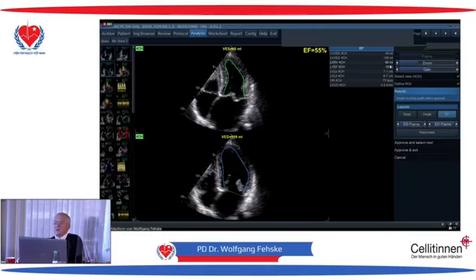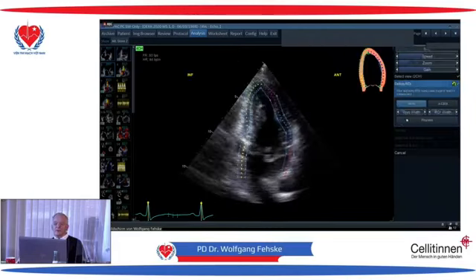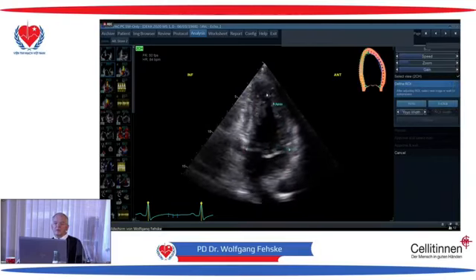It doesn't work. You see the problem? Yes, it is sometimes ridiculous. I do it with the next one still, and so we should be very, very careful with exaggerated quantification.